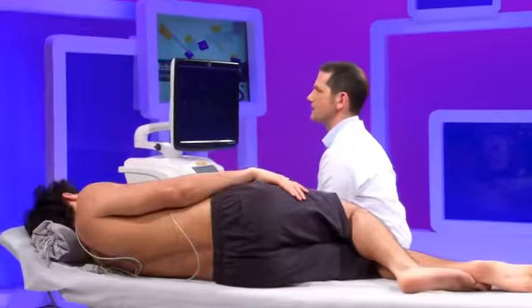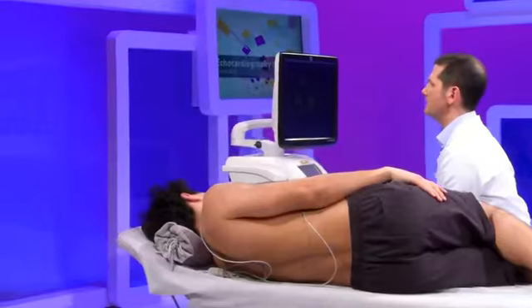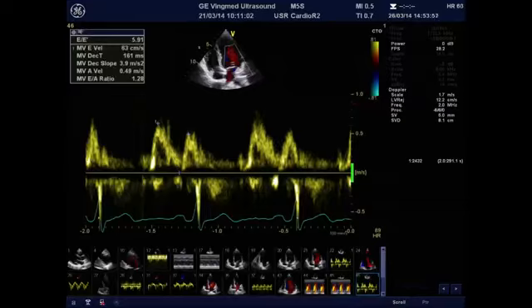So, briefly summarizing the mitral inflow, we have the E wave, which is a good parameter of relaxation, and when relaxation is impaired, we have a reduction in the velocity of the E wave and the prolongation in the E wave deceleration time. And we have the A wave, which is mostly related to compliance and to the level of filling pressures, notably with the LV-EDP. And we can measure the ratio of the E over A, and based on the pattern of the mitral flow, we broadly categorize the diastolic dysfunction degree into impaired relaxation, pseudonormal, and restrictive.